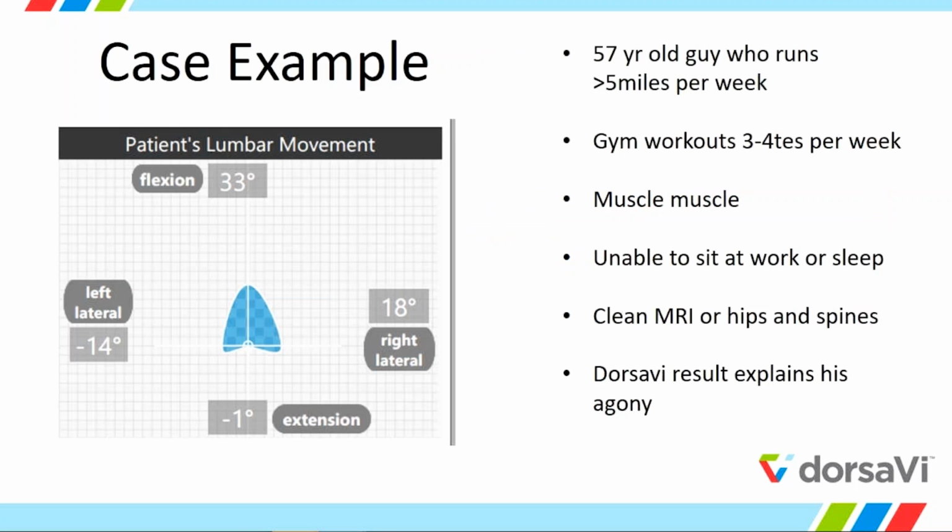Okay, so let's go on to the case example. This just came to me. I haven't had a whole lot of time to study it, but it's an interesting one. And Renuka, are you still on? Yeah, I'm still here. Oh, excellent. So I'll just explain this real quick, what we're looking at, and then I would love it if you could talk about how you applied this clinically.